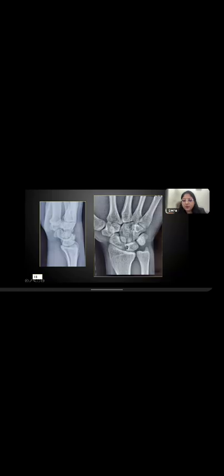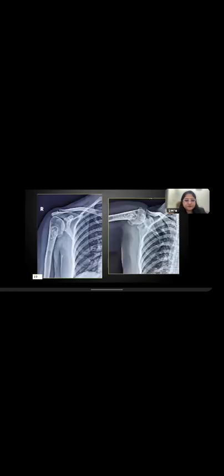And that is why it is important to also examine the patient, because if you examine the patient, you can feel the ganglion cyst, and then you do an ultrasound and you can see that this was a ganglion cyst that was causing an erosion. However, this is a very peculiar appearance of a ganglion cyst causing an eccentric erosion of the lunate bone.